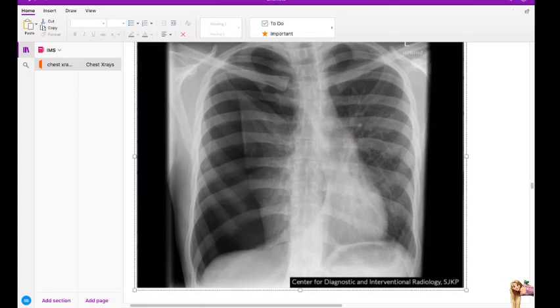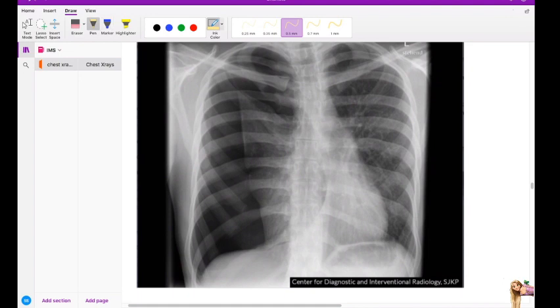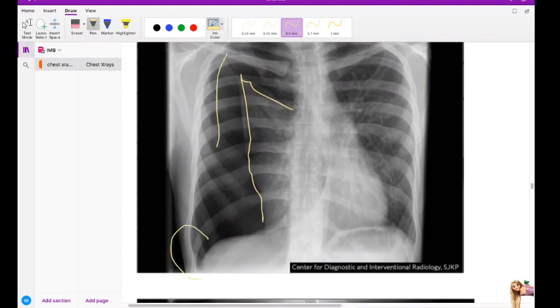Okay, so in here, prominent lobe margin. Where? Okay, so yeah, this is again pneumothorax. Okay, translucent line. It's empty over here. But can you guys see this thing? There's a very deep, what is this thing called? Costophrenic angle. Okay, yeah, very deep costophrenic recess.